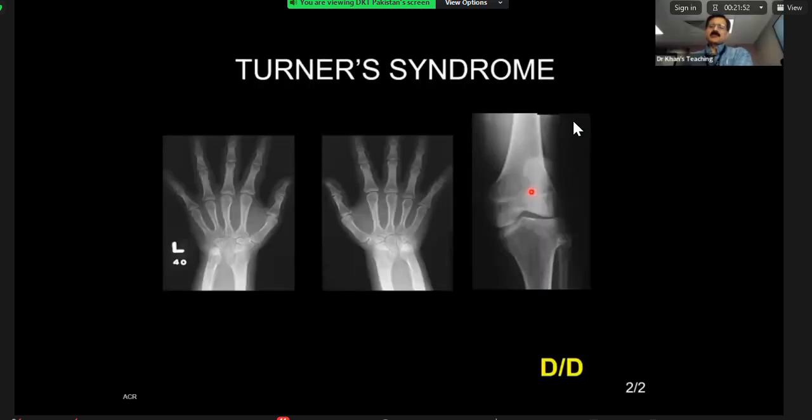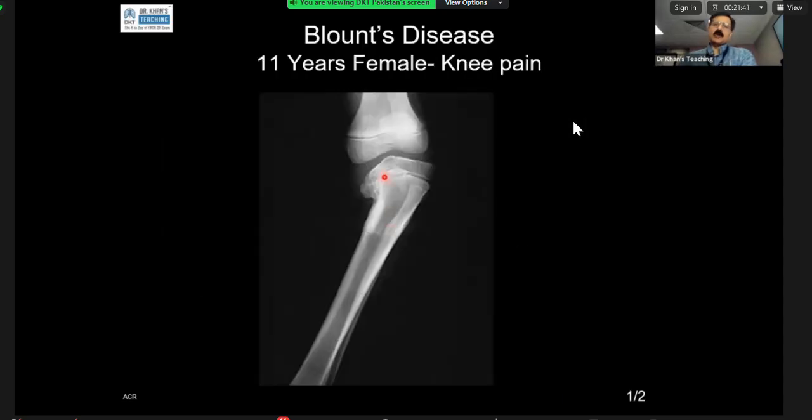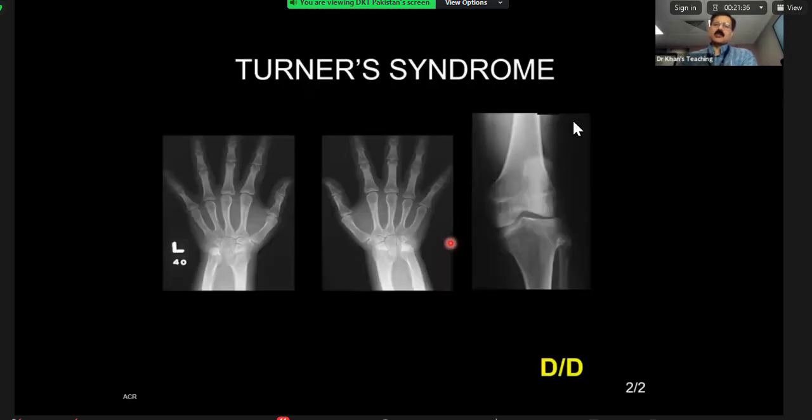Turners. Okay. So basically, you see, this is the medial epiphysis of the tibia, and that is deformed or whatever, and it gives you this kind of appearance. This case is more marked. This one is less marked. The only way it can come in the exam is as a stigmata of Turner syndrome. Turner syndrome is important for the exam, particularly vis-a-vis two differential diagnoses.